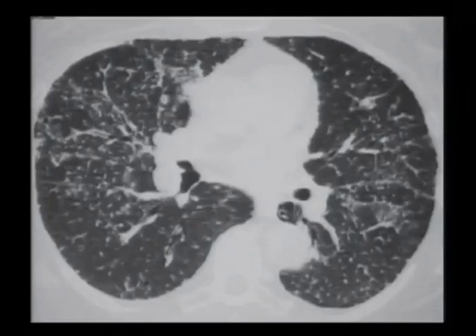Look at an HRCT image. The dominant opacity that you're seeing here is an area of increased opacity that's very small. It's a nodule. When we see nodules, we want to characterize them according to their distribution with regard to the secondary lobule, as well as in the lung in general: upper, mid, and lower, middle third, inner third, outer third, that sort of thing.